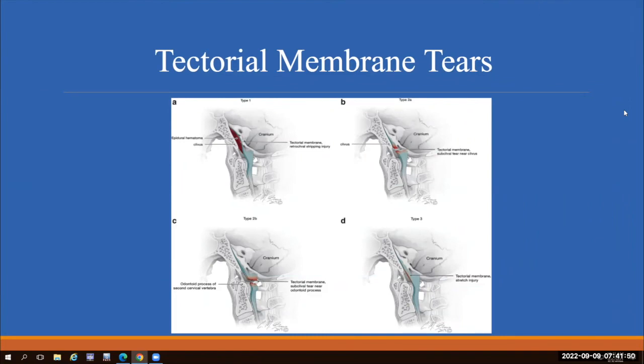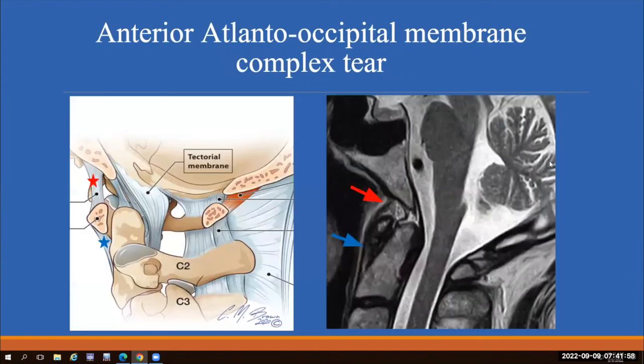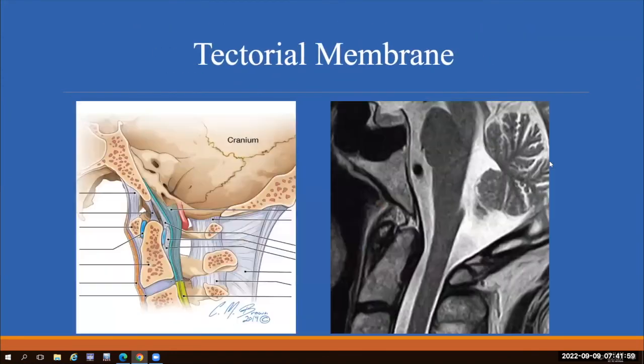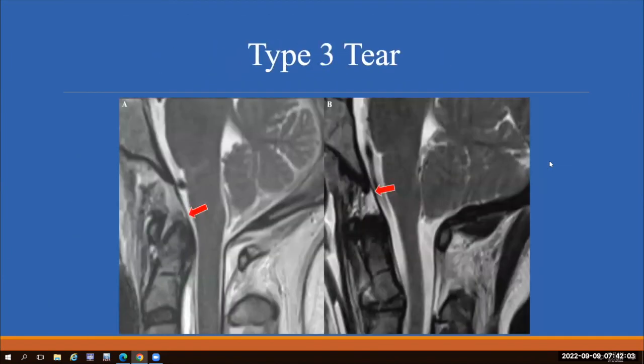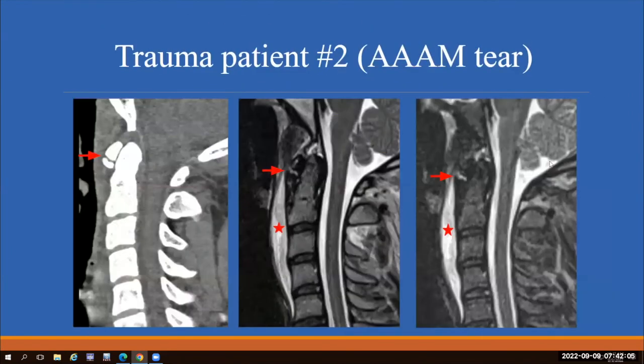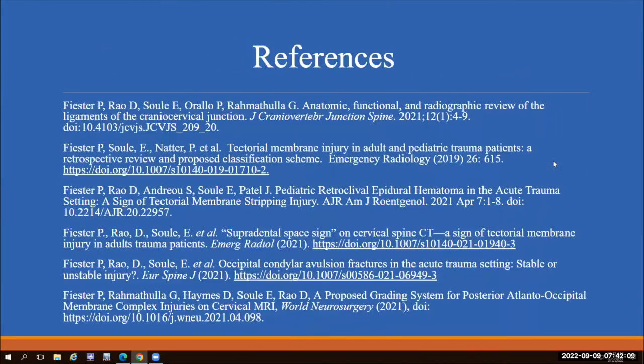Which type of injury? I'm sorry. So it says PLCC, I'm guessing it's posterior ligamentous complex. So in the majority of patients, a CT scan is not going to give you the information that the posterior ligamentous complex is torn, if I can find it. There's only one type of tear in which you can potentially call it on CT scan.